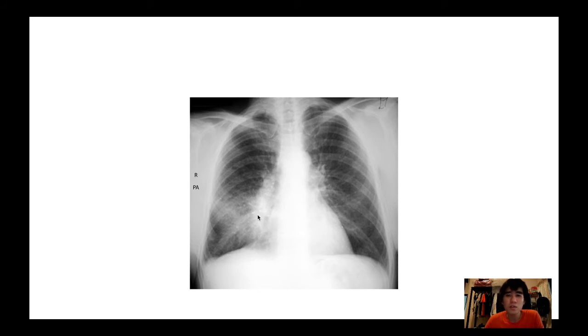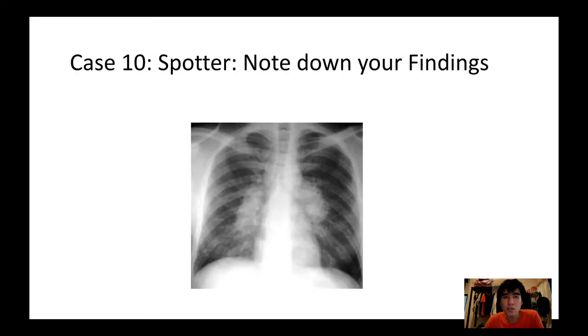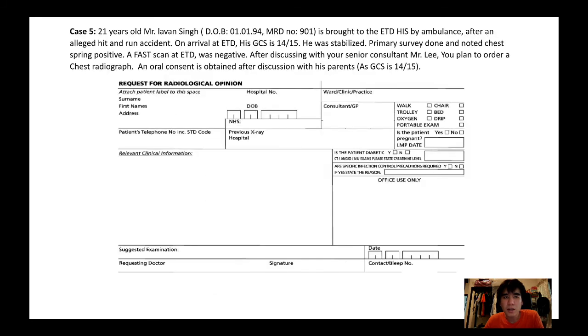Not sure what's causing the pneumonia. Oh well. Okay, I'll just go through all first and write them down, yeah? Because I might not have enough time. I only have 10 minutes until class starts.